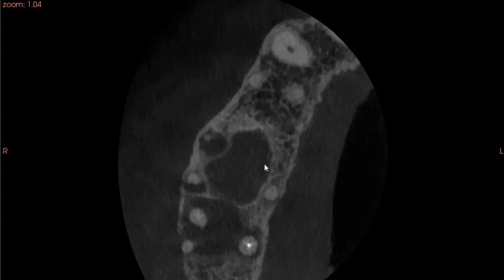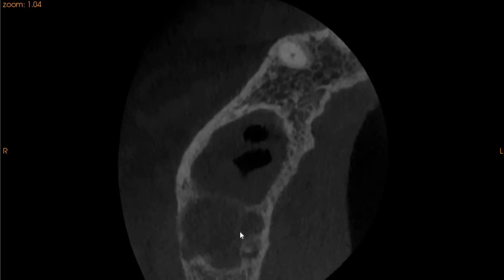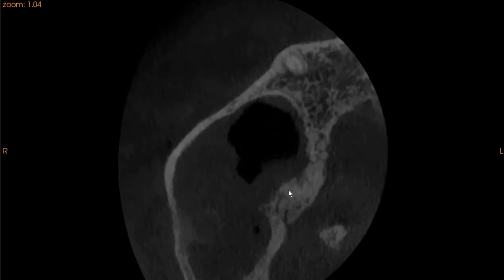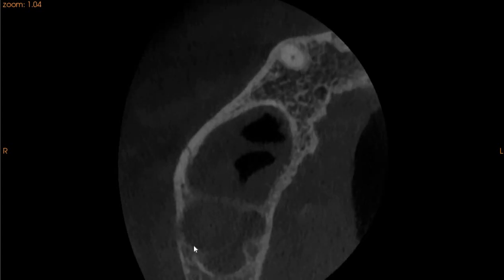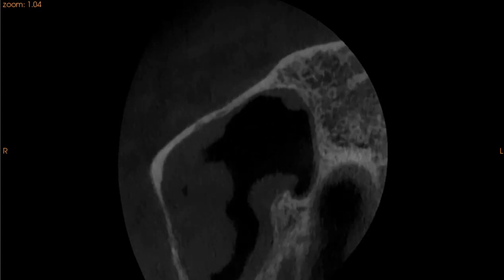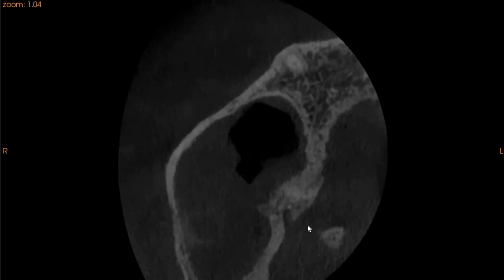Now the sinus is beginning, and here you can see there's two different sinus appearances, and now the sinus appears to be homogeneous in one at this point. This point is just the periapical infection associated with the 7, and as we move more superiorly, now the sinus is uniform at this point, but we can see extensive sinusitis in this region as well.